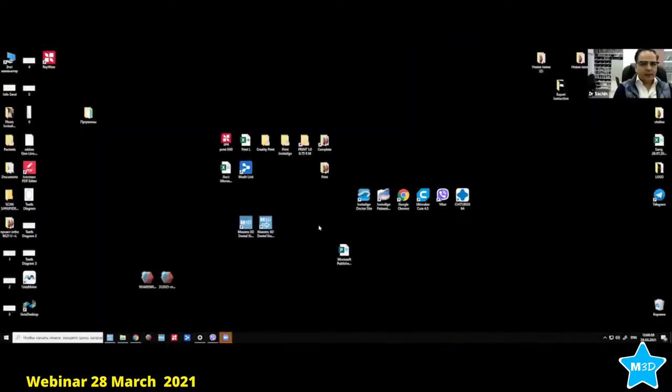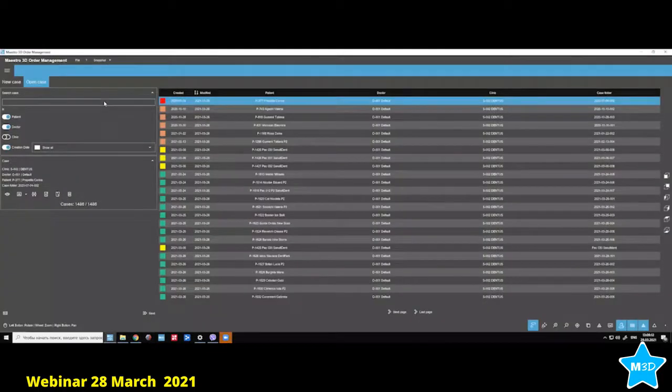Okay, so I'll try and share my screen with you. Can you see my screen now? Matthias, can you see my screen now? Yep, it's perfect, Sachin. Everything's fine. Perfect. So we'll do the import. My friend Alexander will come on the screen now. He's going to do an import of a simple case, do the segmentation, and then we'll talk about attachments on that case, right?